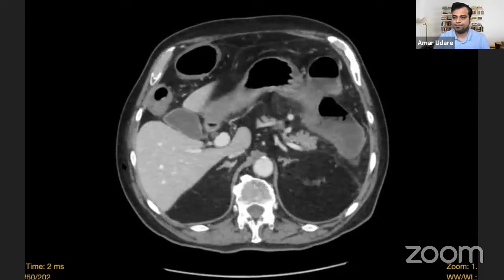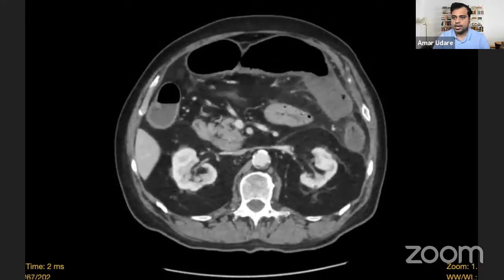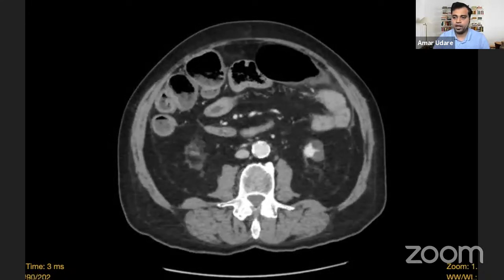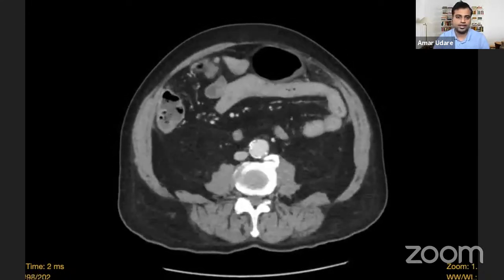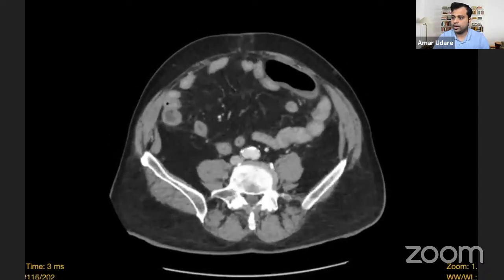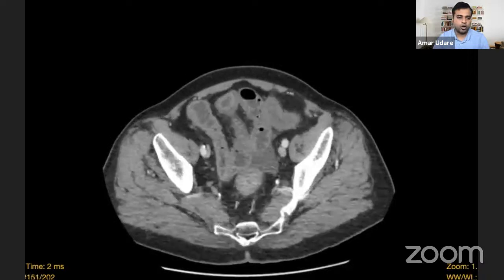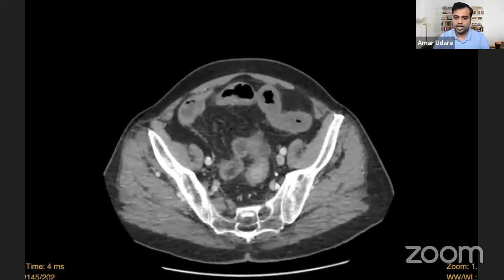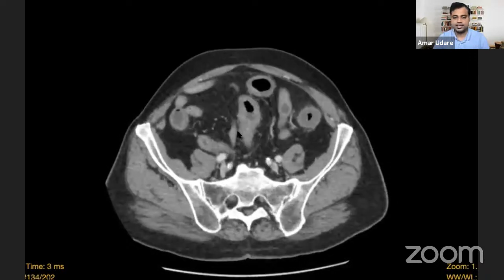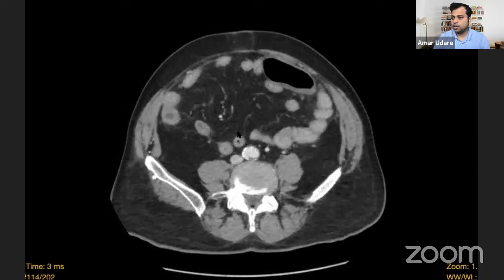So this patient was in the ICU. They had a myocardial infarction a few days ago. So that's a clue to the diagnosis. I'll go over the images. If anybody spots anything abnormal, you can let me know in the chat, and I can go over the findings. So that's the actual CT. I'll scroll once more.